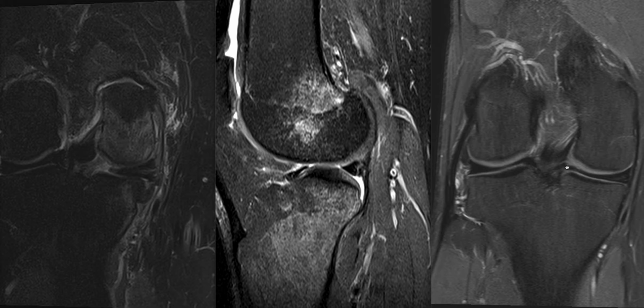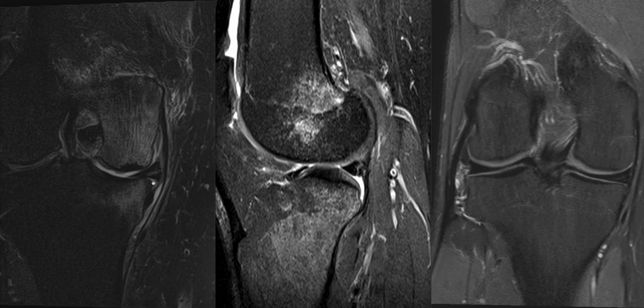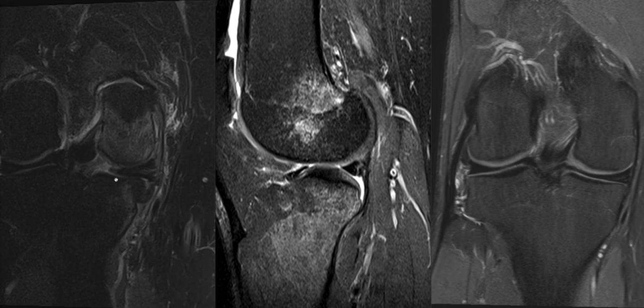Here are the two normal meniscal roots. Here you can see the meniscus coming down and then inserting by fibrous attachments to the tibial plateau. If we look at this patient here, we can see that there is a cleft where the meniscus normally attaches to the meniscal root. Because its attachment is disrupted, it's not surprising to see that the meniscus also springs out and becomes partially extruded, where it sticks out from the normal confines of the compartment. And often this meniscal extrusion is the first sign that you see in patients who have posterior root tears.